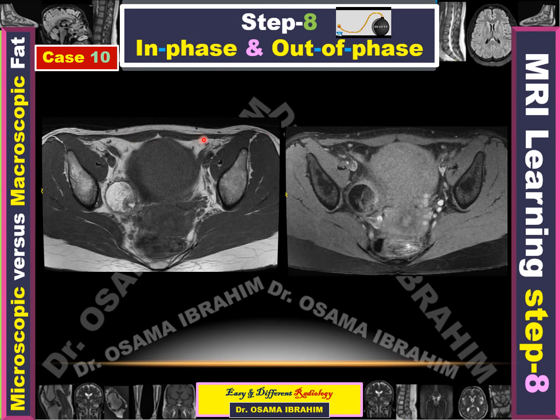Case 10. Ready for the 10 seconds. Is there any opposed phase? If there is none, then you're dealing with macroscopic fat. Where is the fat suppression? This is the fat suppression. Time out. Okay.